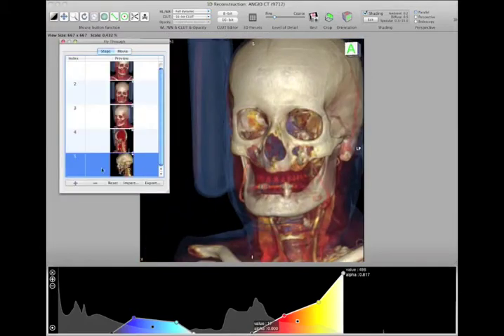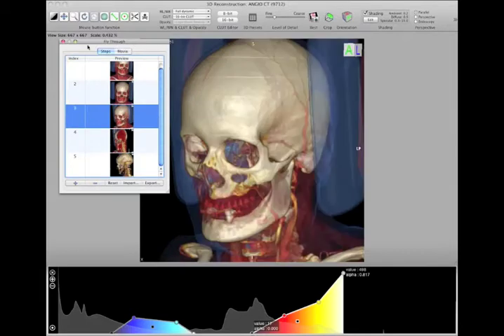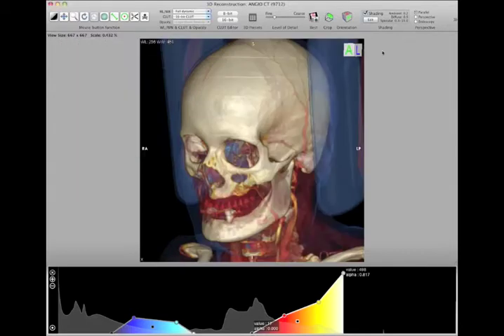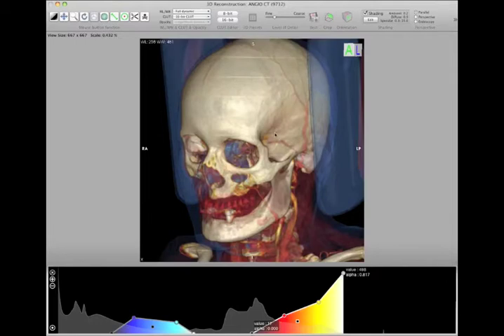You could now go back and modify this by deleting certain keyframes and re-adding them, but generally I just make a new movie every time I do it. If you wanted to export a QTVR, you could do it here, and you can set this one takes the longest, but will yield the best quality, most number of frames, all of that. Okay, and again, you would give it a name and save it.